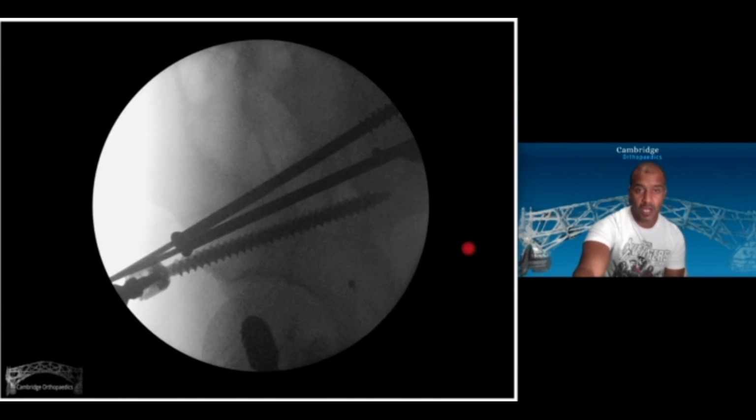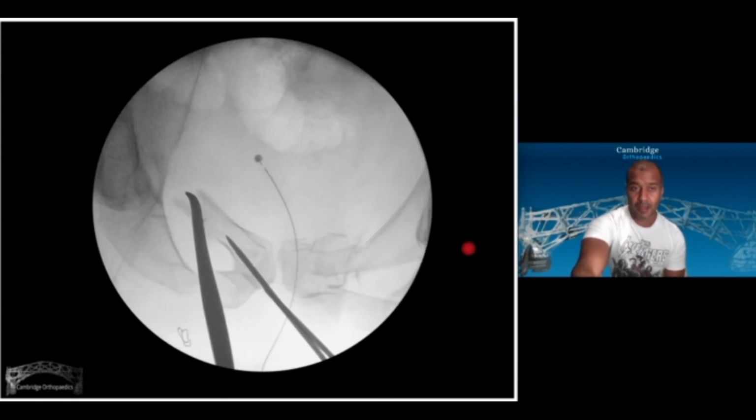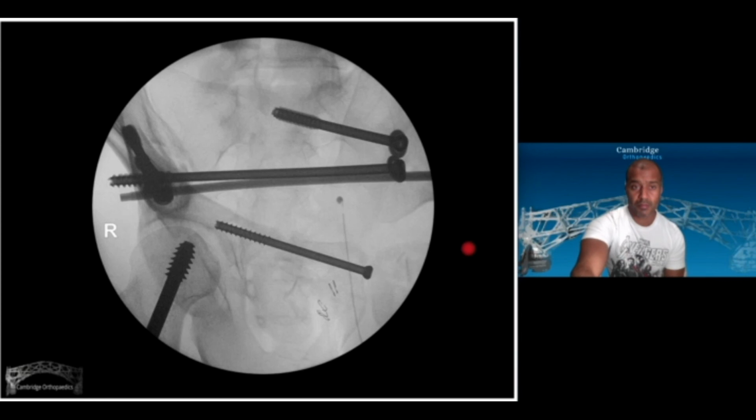And two divergent LC2 screws supported by an infix, and a percutaneous reduction of the anterior ramus, because I want some continuity at the anterior structures to reduce his risk of a non-union. I think there's a high morbidity yet to be proven about the floating pubic symphysis. And an ACS just to support that construct.